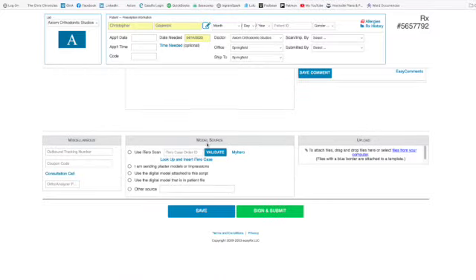And then the model source. I come down here to the model source. If you have the iTero scanner, you can just add the case number. I don't have the iTero scanner, so I'm going to use the digital model attached to the script. Then I'm coming over here to my other screen, and I'm grabbing my scan. This is my maxillary, and I just drug it over there, and that didn't work. There we go.